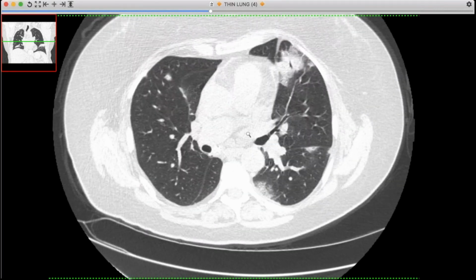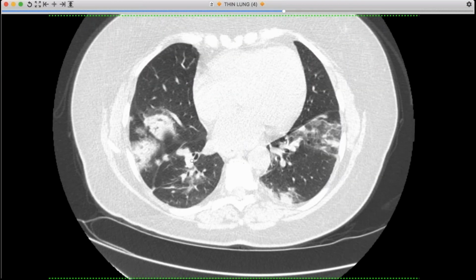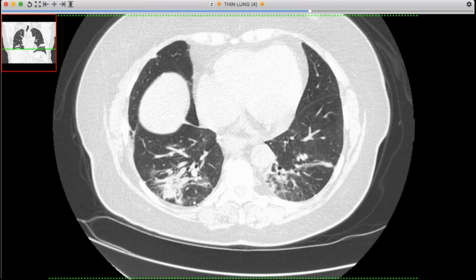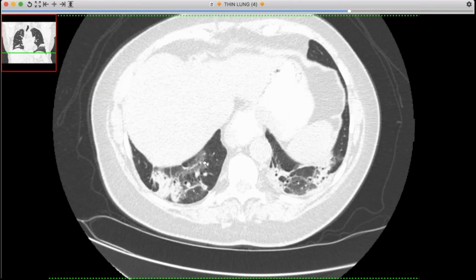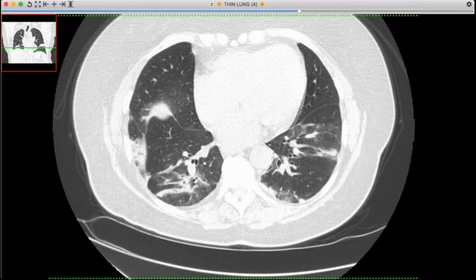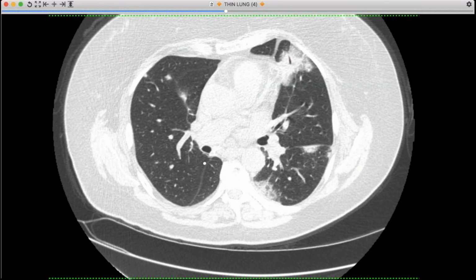And so in my conversation with the oncologist, there was some confusion because they had treated this drug reaction. They had not restarted the drug. You can see the lower lobes were continuing to clear up, sort of cleared from the center out, which is what we see with organizing injury. So when I asked, I found out that the steroids, they had gotten down to a pretty low dose.